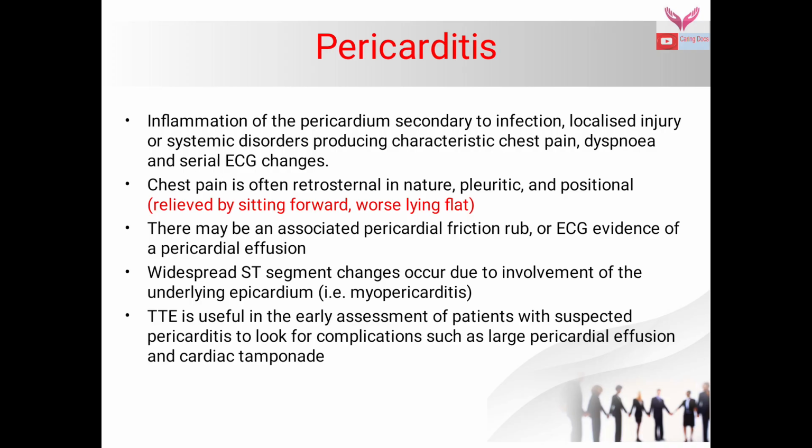It is relieved by sitting forward and worsens while lying flat. There may be an associated pericardial friction rub or ECG evidence of a pericardial effusion. Widespread ST segment changes occur due to involvement of the underlying epicardium, that is myopericarditis.